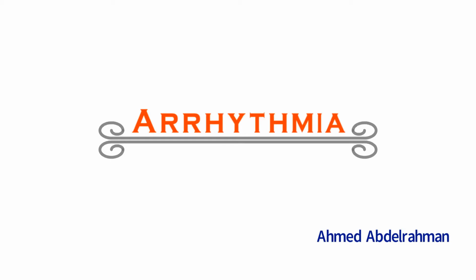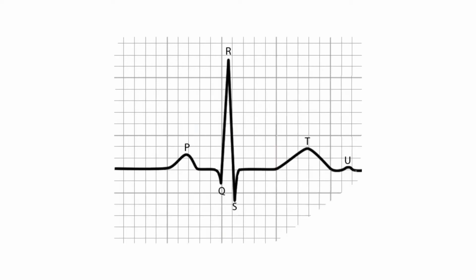Today we are going to talk about arrhythmias in the USMLE Step 2CK. So let's start with the normal electrocardiogram, or normal ECG.